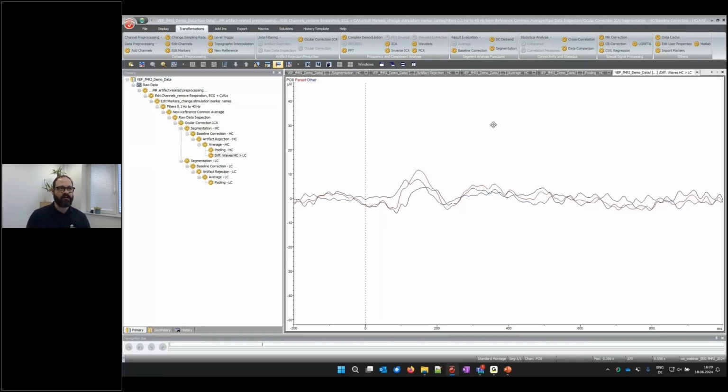You can actually also right-click and say, don't display this static overlay. And now you have basically what's the activity increase between the low contrast to the high contrast condition. So this is something, especially if you're coming from the fMRI world, you might be familiar with looking at contrasts between conditions. So this is basically the equivalent that we have in the EEG.